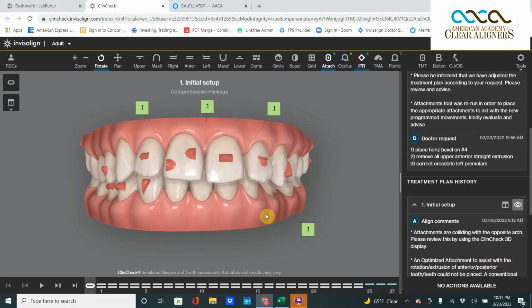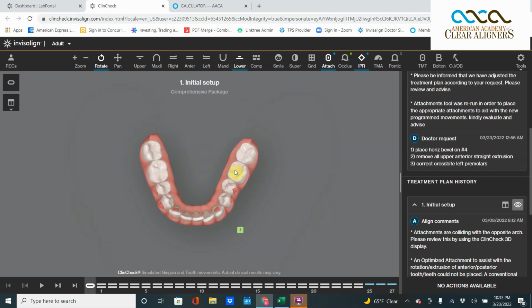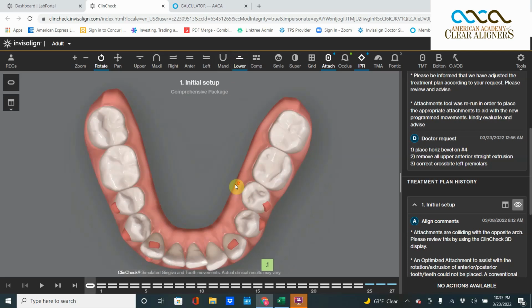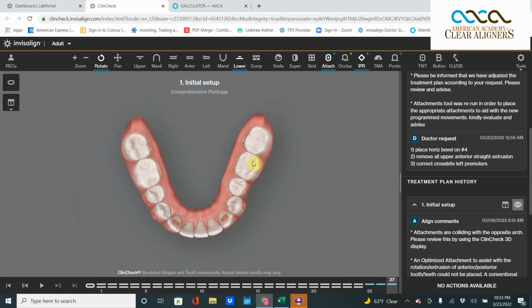Today we're looking at a weird nuance. Sometimes the system sees a tooth that is very rotated. I'm not really sure I've ever seen something like this, but it sees a tooth that's very rotated, and it's going to rotate it, and it sets that tooth up mesiodistally very nicely, and it matches it up incisio-buccolingually very nicely. So if you look at tooth number 19 and 20 here, number 3, 6, and 3, 5, you go, nice job. You did a good job. You took a tooth that was positioned incorrectly, and you rotated it and moved it nicely.